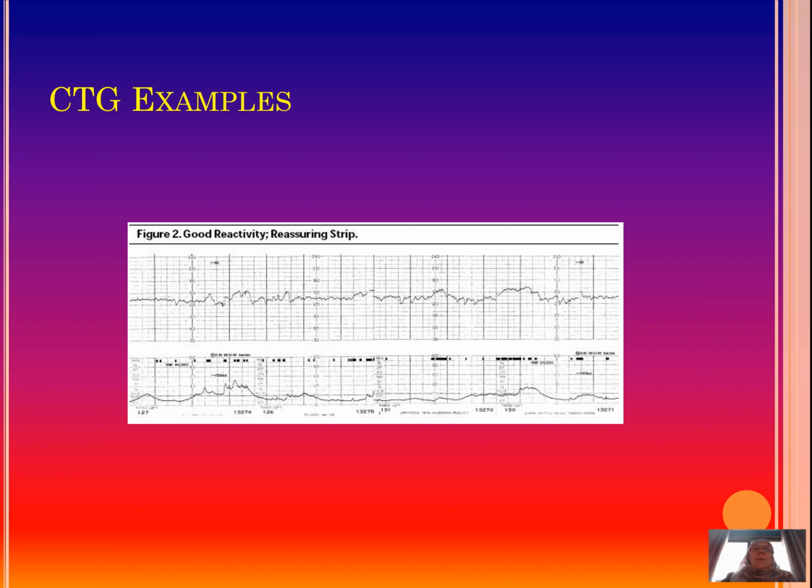So here, if you look at the contractions, you do not find regular contractions on this CTG. You find maybe a singular contraction and then another singular one, but they might just be tightenings. Above that, you see the fetal monitor documents fetal movements.